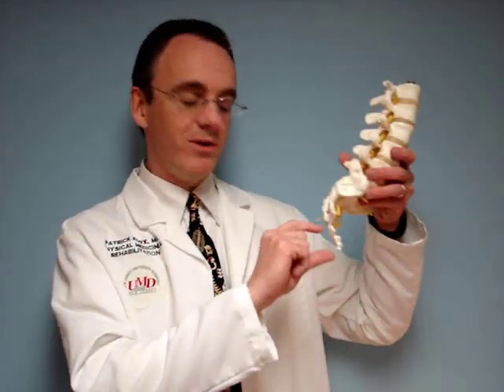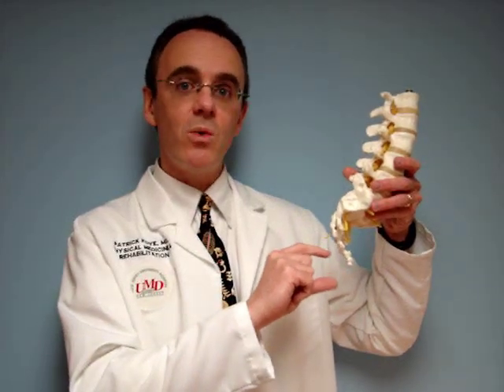The other thing you can do is to get a copy of the actual images. For this, the radiology center may be able to just burn it onto a CD for you or loan you the actual films or images. And you can take a look at those and you can see whether you can actually see the tailbone included in those images or not. The other thing you can do is take those images with you to your doctor's visit and ask your doctor to specifically point to the spot where the tailbone is on the x-rays.